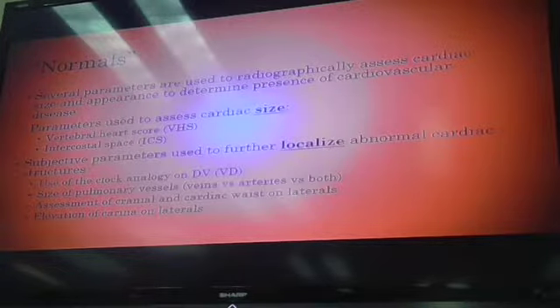What I mean by localize is we're gonna determine who is causing the abnormality, or what part of the heart or the cardiovascular system is causing it. And all of these abnormals are gonna clue you in. So when we talk about left-sided heart changes, we're gonna look for things that are abnormal or causes abnormal appearances on the left side.